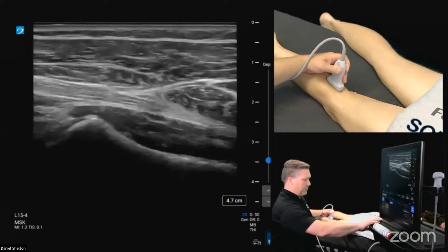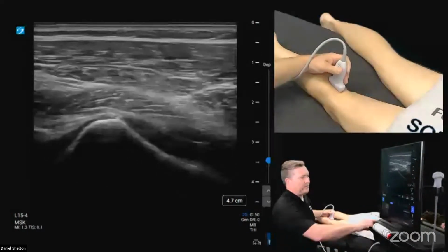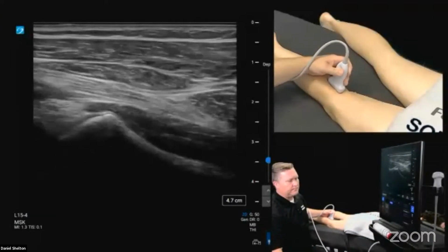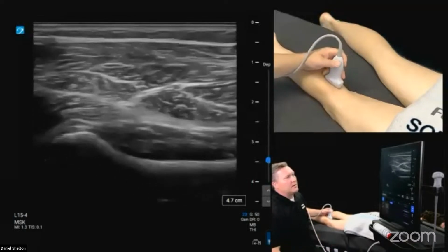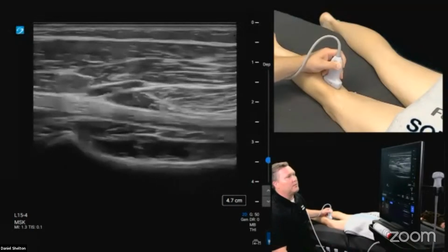I think I almost need a bathroom scale in here so that you guys can get a sense of just how sturdy this thing is, and that it's not going to fall over. It's a very solid machine. So a lot of clinical considerations went into this machine, and it sure does not lack the image quality, which I think everybody can see online, which is nice.